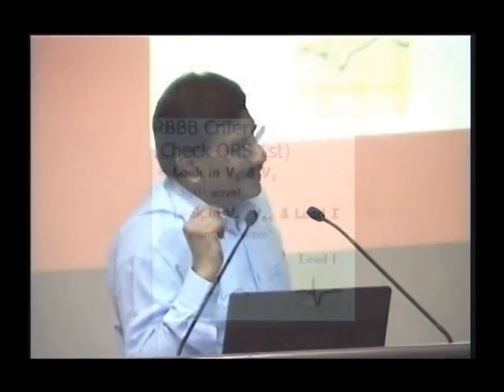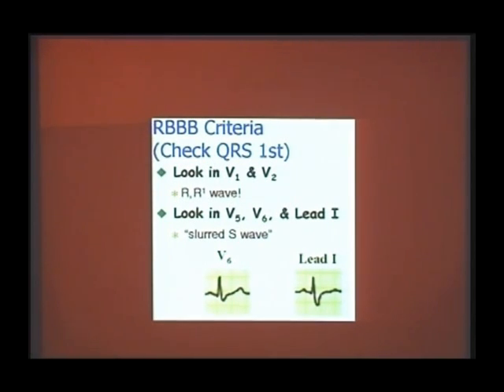Please remember, my V5, V6 is here, my L1 is just above. My L1 is a horizontal lead, my V5, V6 is also here. So V5, V6 and L1 are closely related to one another. They are very proximal leads. So in the majority of your ECGs, the QRS complex in V5, V6 is almost similar to L1. It's very logical, isn't it? So my V5, V6 majority of times will resemble my L1. L1 will be almost like V5, V6 in the majority of normal ECGs.